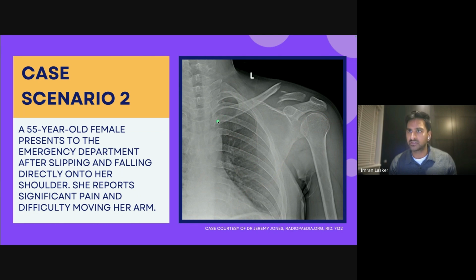Raised a hand. You've raised a hand. Okay, I can try and answer that in a second. You go along like so, and you can suddenly see this completely outlined. This kind of veers off this way and then goes along this way, right? So therefore, this is the problem.